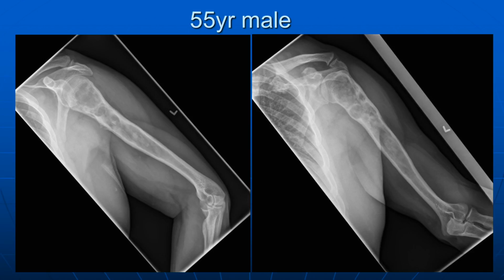You can tell that it's an aggressive tumour because as soon as any tumour starts to break outside the bone, then it's aggressive. So that's what we see here. The tumour's starting to come outside of the bone, and as soon as it does that, then it's kind of game over. The tumour wins. So this started out as a cartilage tumour or an enchondroma, and it's eaten out of the bone. These are really difficult management cases.